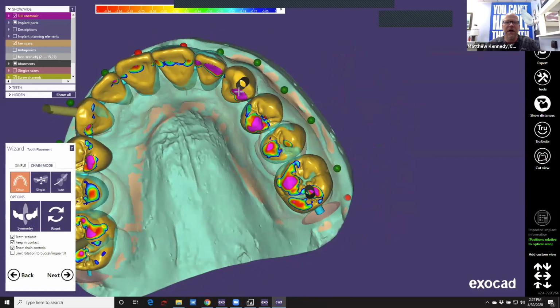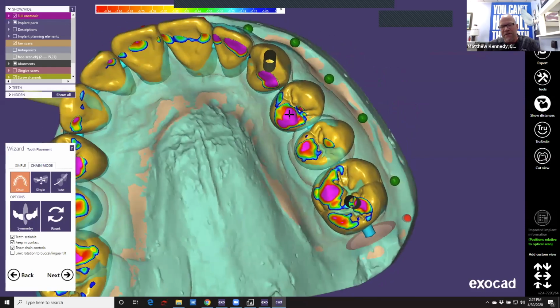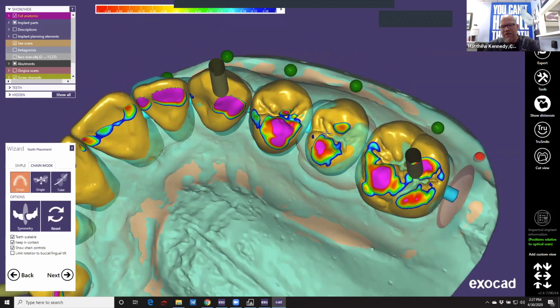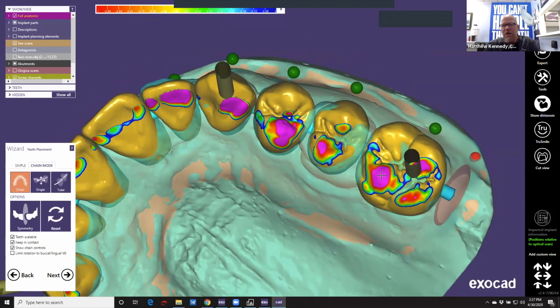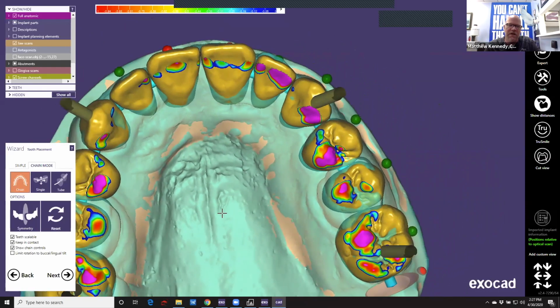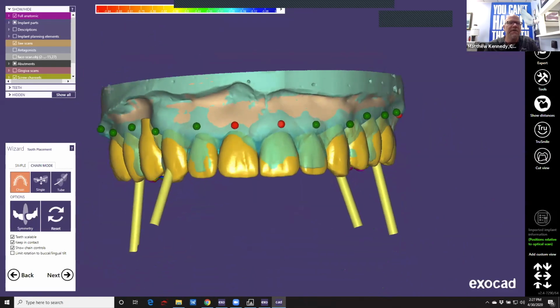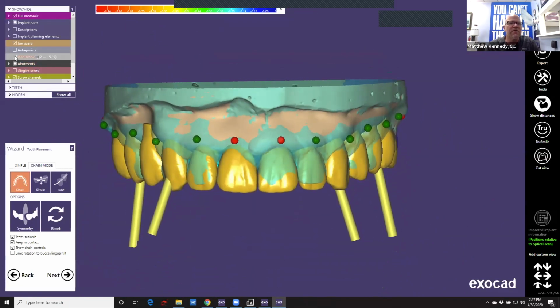And again, we're just trying to blow through this real quick to get the gist of it. I also am missing one bicuspid. I would have changed this to 1 bi and 2 molars. On males, I like to do 1 bi, 2 molars. On females, I like to do 2 bis, 1 molar. But I'm gonna go with my feminine look today, and we're gonna see how that works out for us.